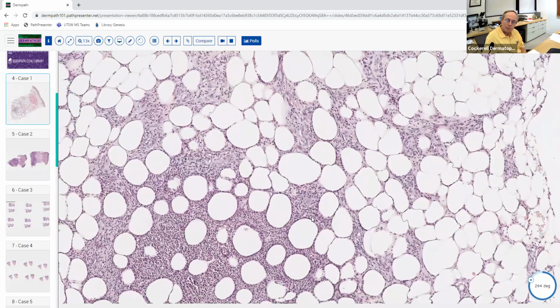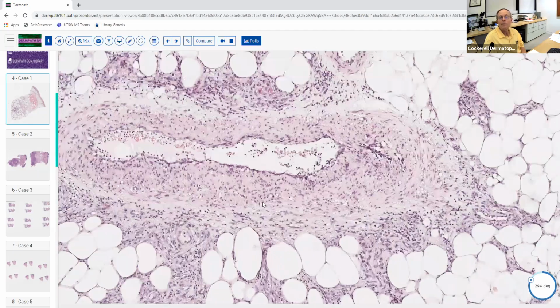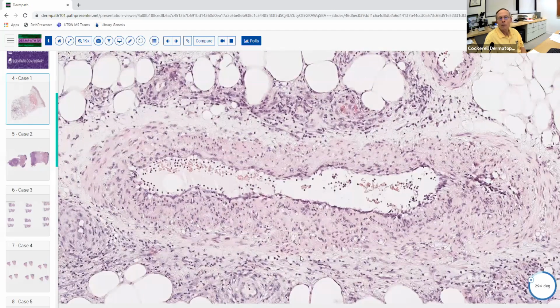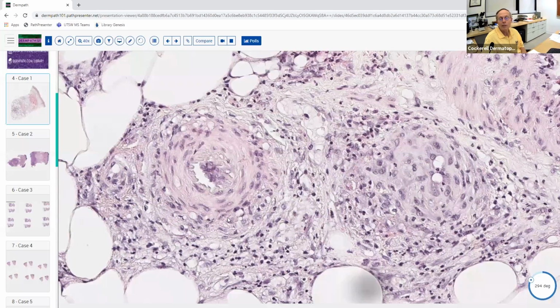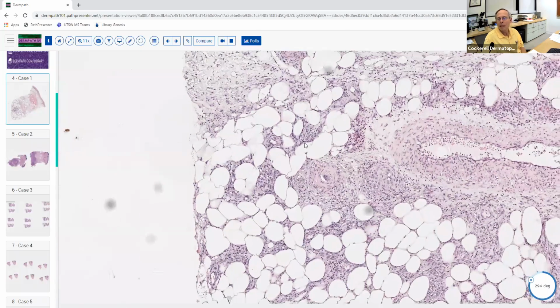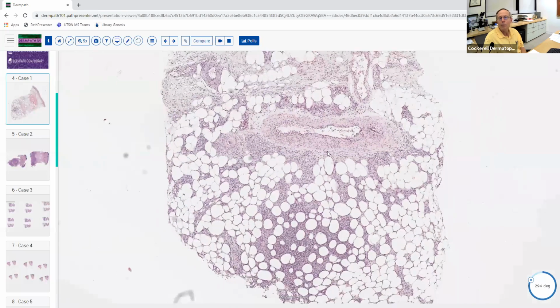It's got some neutrophils. It's got a little bit of granulomatous inflammation. It's not like sarcoidal granulomatous inflammation. Then it's got this pretty large blood vessel here, and there's some inflammation in the wall of the blood vessel. And then there's this other blood vessel over here that does look like there's definitely some inflammation in it. So I think you could probably say, this isn't the world's best example of vasculitis. There's definitely some vascular inflammation associated with a lobular mixed panniculitis.